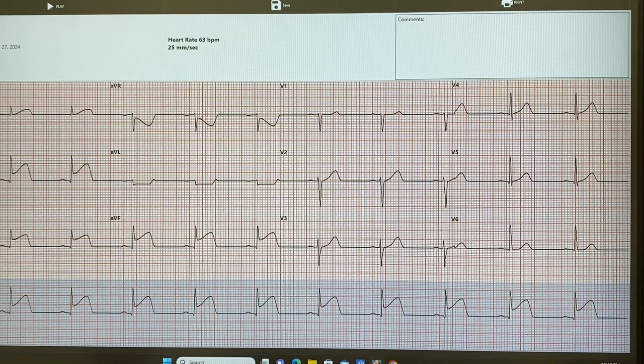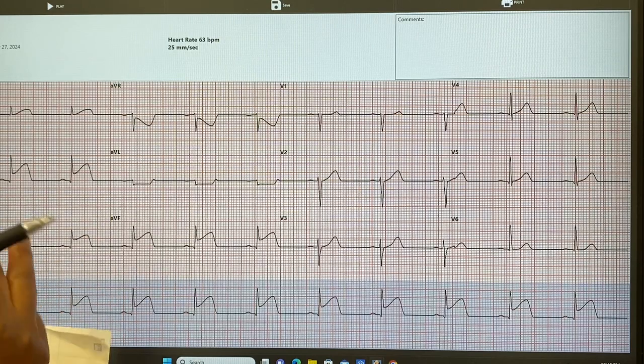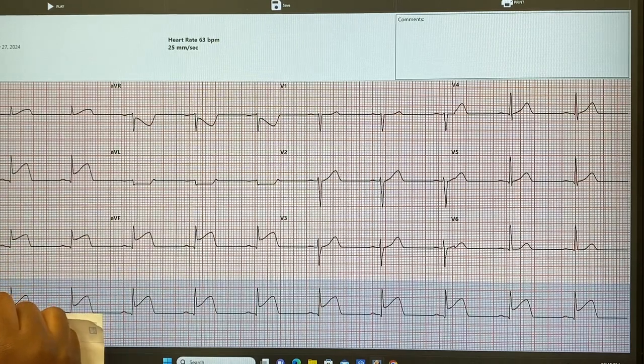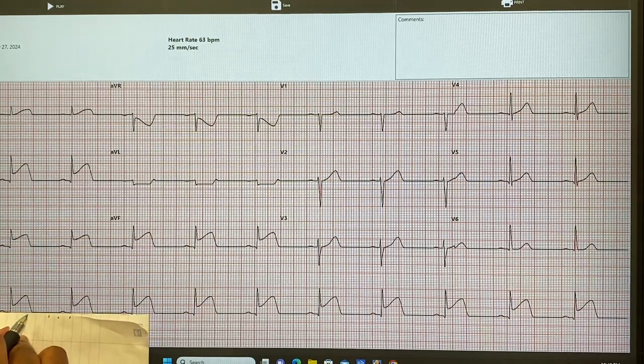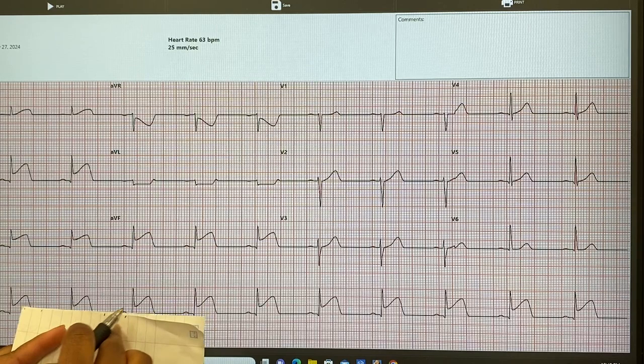And next I'm looking at, sorry, I don't have your system down yet. That's okay. So help me. You look at whether the PR interval is normal or prolonged. The PR interval is normal. It's not prolonged. Okay. So it's normal, but are they all consistently normal? From the beginning of the P, just to be sure. So the PR is from the beginning of the P to the Q, or the start of the QRS complex, you could say.